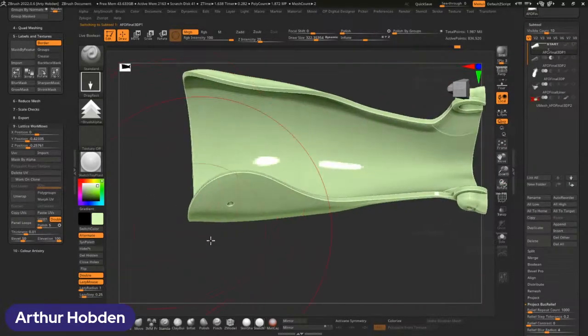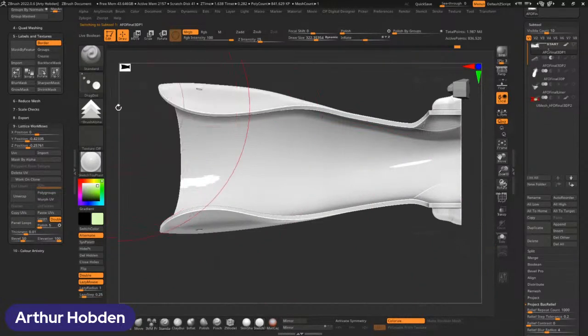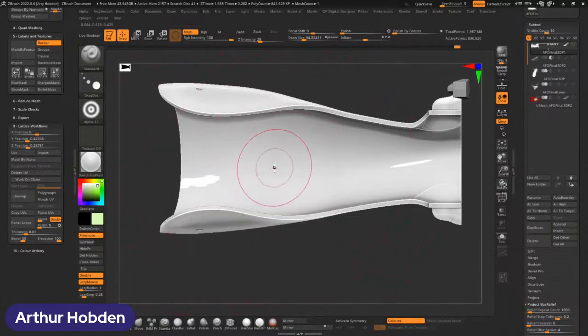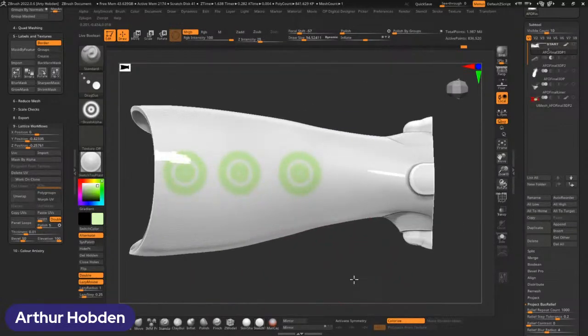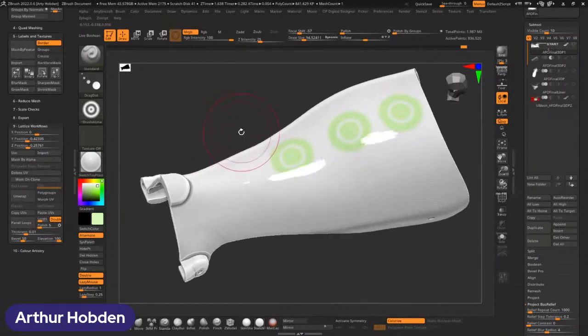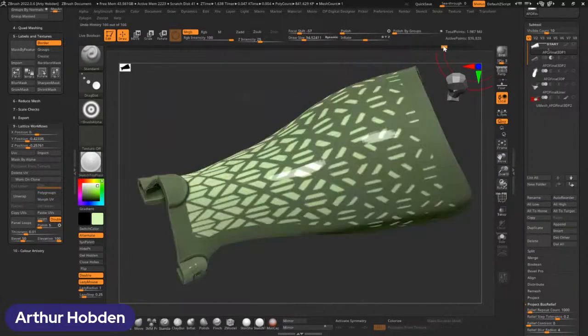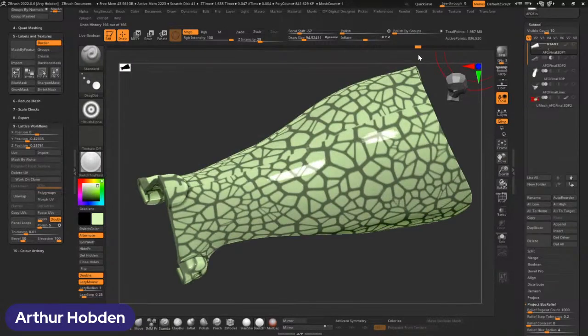Let's go back to this example where we're colorizing and dragging a dot maybe of something like this in color green. So again, you can stamp different things to your device and you can color it just like this. The easiest and most effective way, however, to do color is not to use these tools like this. You're actually way better off. There we go. Something like that.